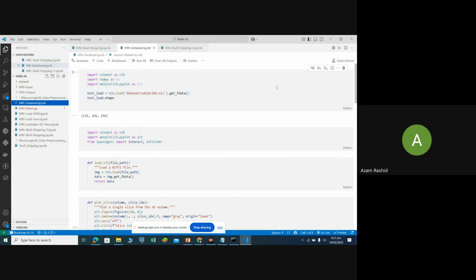Now we start. First of all, we import some libraries for the demonstration of the processing of our MRI. The first library is Nibabel. Ni means neuroimaging. Nibabel is the most important library for dealing with neuroimaging, because it reads 3D MRI images and other 3D computer vision views.